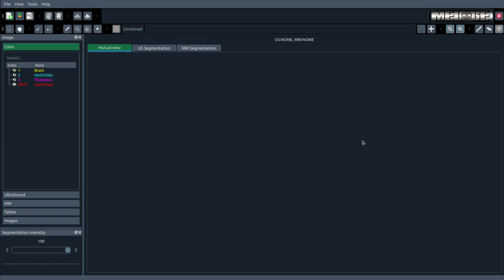Hello and welcome to this tutorial on Melage software. Today we'll explore the menu options of Melage.